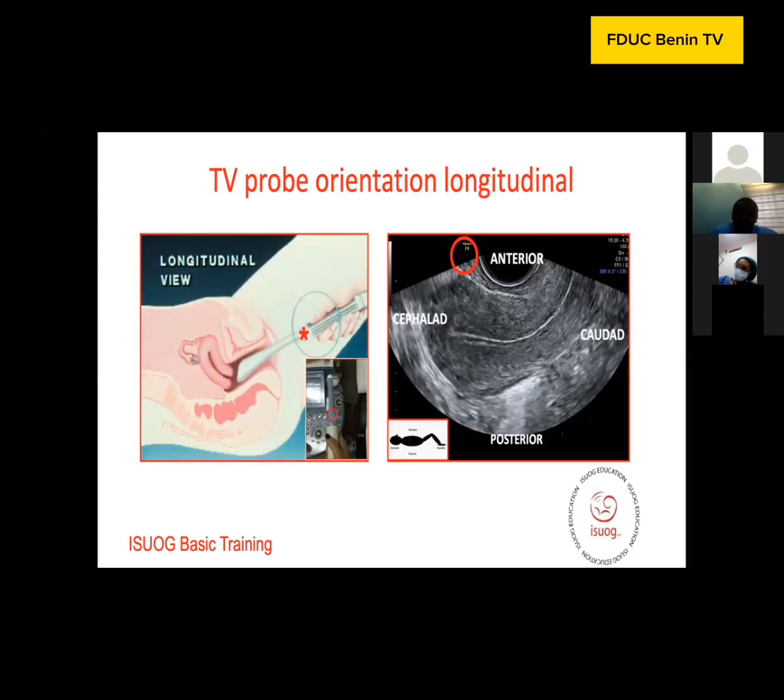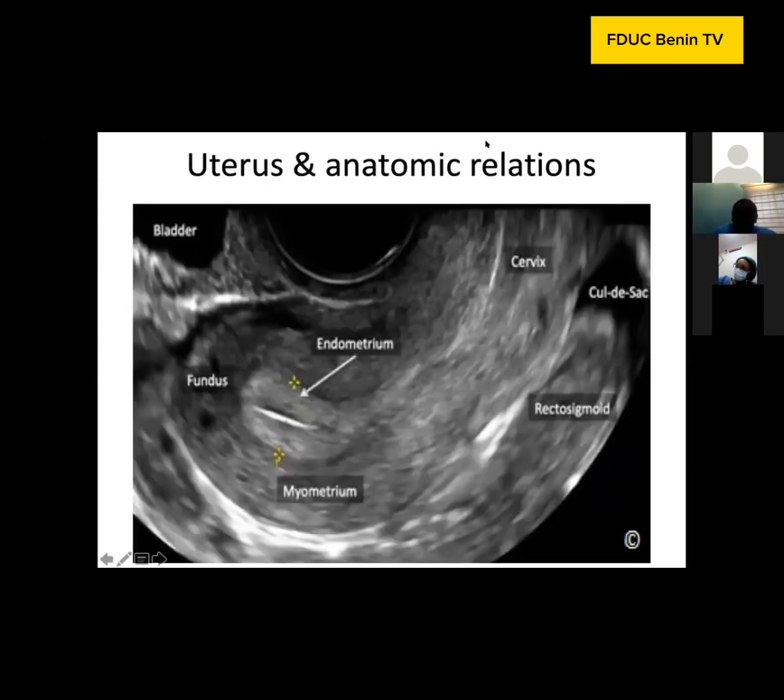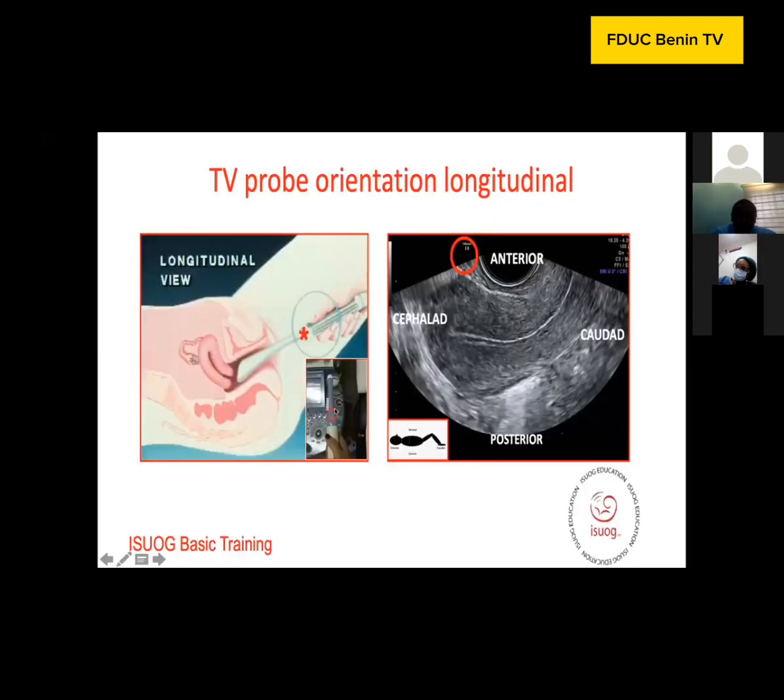Something I think we need to discuss, and quite important, is that on every transducer, you have the probe marker, or the transducer marker, which is in this screen here at the 12 o'clock position. All transducers have a corresponding marker on the ultrasound scan machine. If you put gel at the tip of the transducer and you touch the transducer, you will see some activity on the screen, wherein that activity is the position of the corresponding orientation.